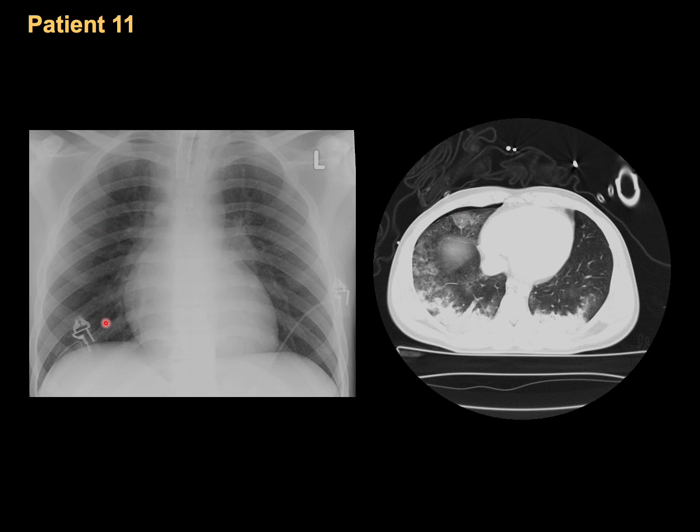So you have to go hunting for it. You will find that the sulcus is a little bit deep, and the diaphragm is almost in the same line as the other side. This could be the only clue, and you have to be very suspicious of pneumothorax. So chest CT is here the diagnostic tool to exclude it, and it confirmed the presence of pneumothorax on the right side.